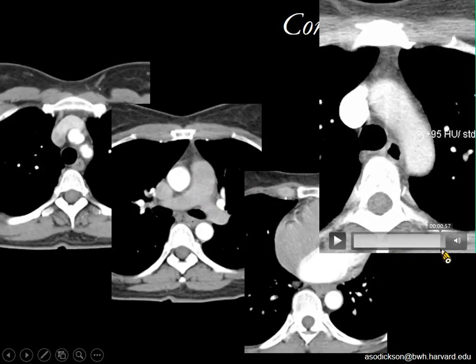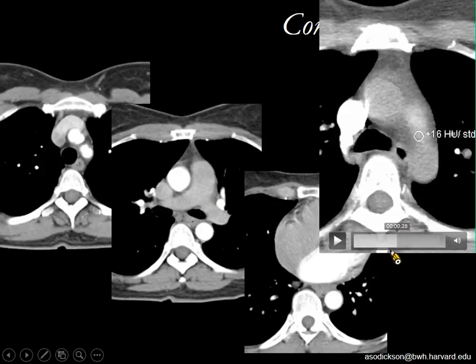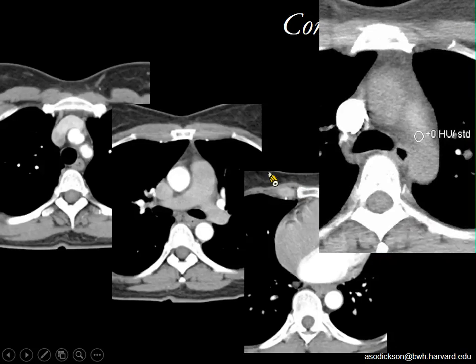We ended up in the aorta. So the patient here took a different breath hold. So they took a breath hold, they imaged the pulmonary artery, they put the region of interest here. The patient unfortunately breathed differently for a monitoring scan, and we missed the bolus. Now, this could be avoided if the technologist is not relying so heavily on our technology, and if they're watching the scan, they would recognize that we've fallen off the pulmonary artery, and you can actually tell with some experience from watching the images when the contrast is flowing where it's supposed to.